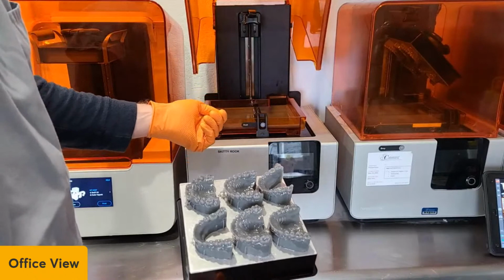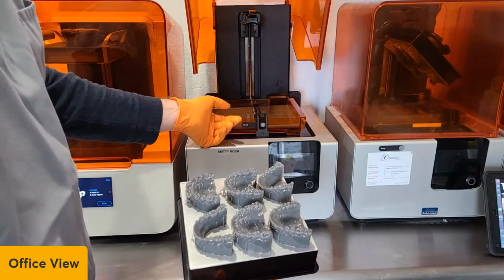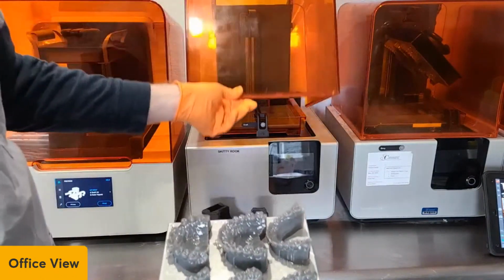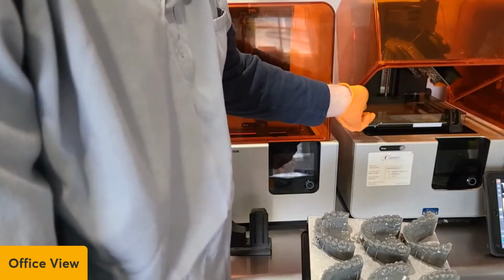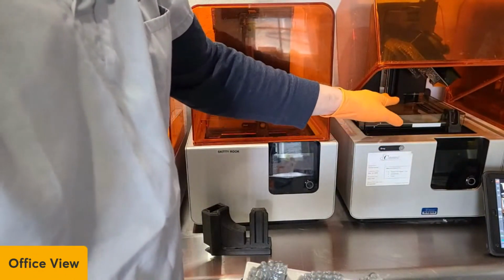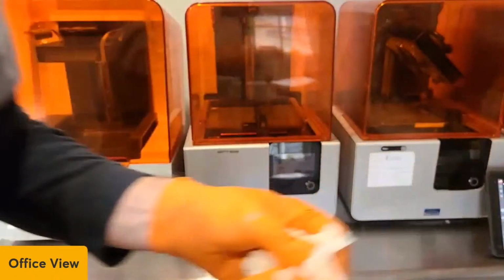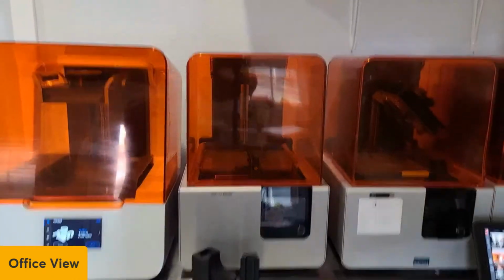And so you have to replace this every 2 or 3 resin tanks. There's a green one here, and those are LT tanks. Disregard my broken thing. That's an LT tank, and it's supposed to last like 7 or 8 resin cartridges. So 7 or 8 of these resin cartridges, which are back here in the back.